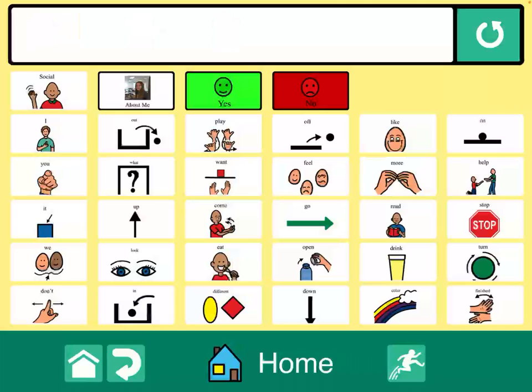I like that feature because it helps you backtrack and create full sentences. You don't have to have it. The other option is that when you press the buttons, it says the buttons as you press them. And you can see that the sentences aren't fully grammatically correct, but for students who are not using a full vocabulary, I think that that's perfectly fair.